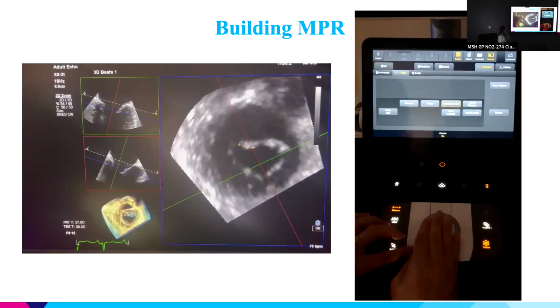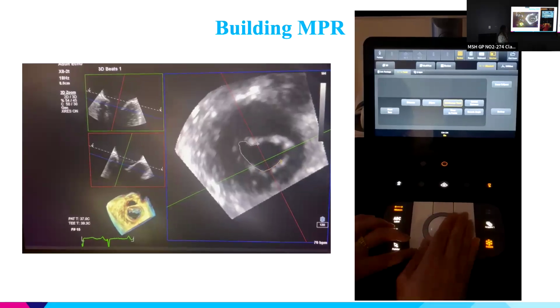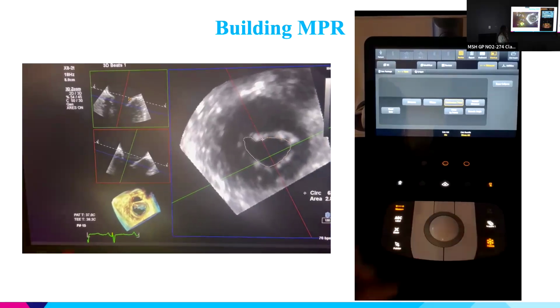So 20 seconds. It really shouldn't take longer, and that's when you're doing it. You don't have to do it in real time. You could post-process it, but it really shouldn't take you longer than that. I'll let it play again because I was chatting in the beginning.